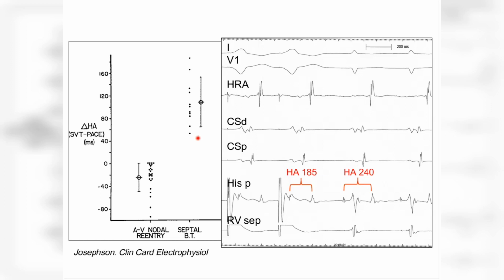As I said before, the HA interval is different than what is the measurement during AV nodal reentry, as shown here on the left part of the slide.